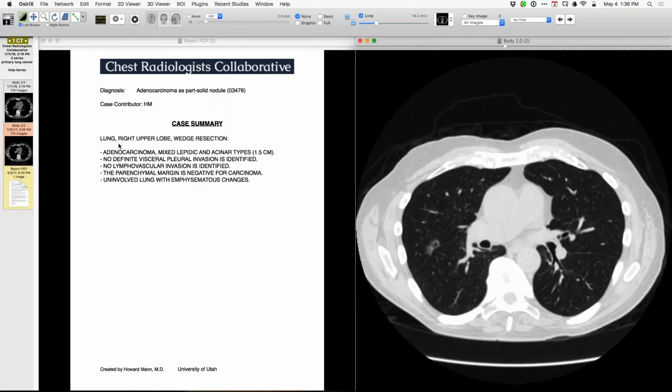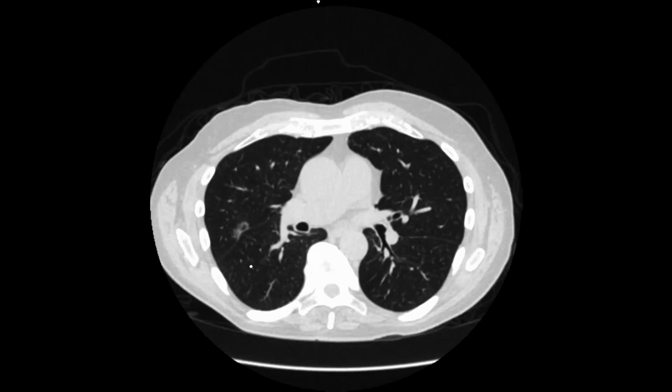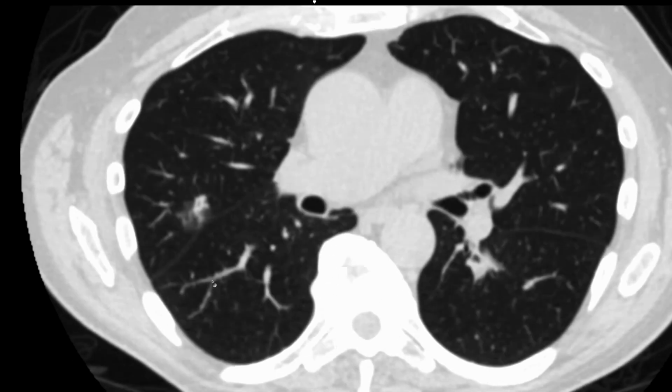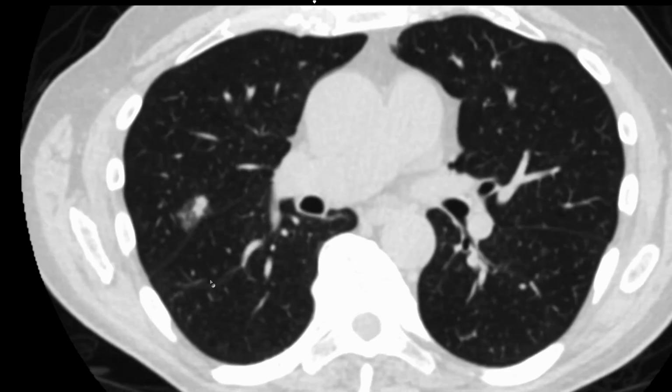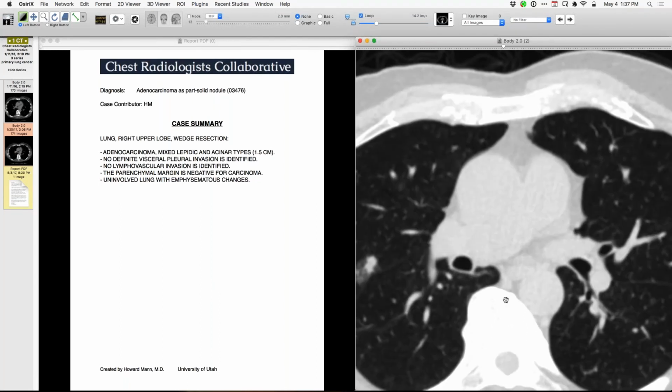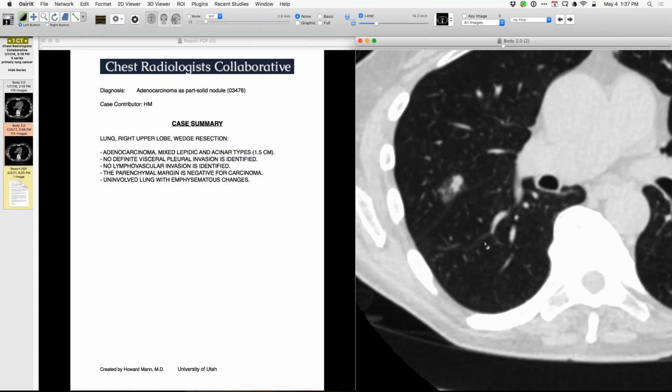All right. So they used to call that the tail sign of an adenocarcinoma in the old chest film days. You'd have a peripheral lesion, say, up in the right apex, and would often have a little line that went out to the pleura. So it was called a pleural tail, and that was supposed to help you distinguish a carcinoma from a granuloma. So it's probably the same phenomenon. There's probably a little fibrous tissue that's generated that actually is what causes the tethering here of the fissure, or the little line that would go out to the peripheral pleura.